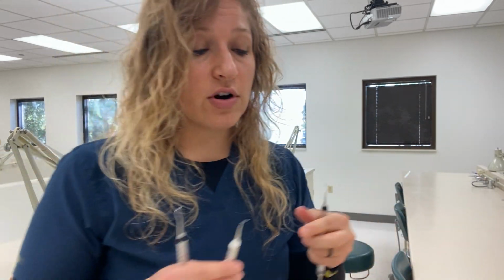As far as sickles or supragingival instruments, think about it logically. These have a point, so we're going to use them above the tissue. That's your textbook answer, supragingival. But I also want to say real world things here. All of us are going to tell you that in the real world, we sneak that sickle scaler a little bit underneath the tissue. We are very careful about adapting, but there are definitely many of us in here who will say that we use it just a little bit underneath that gingival tissue in the real world. So keep in mind the distinction. That's not your textbook answer. That's your real life answer.